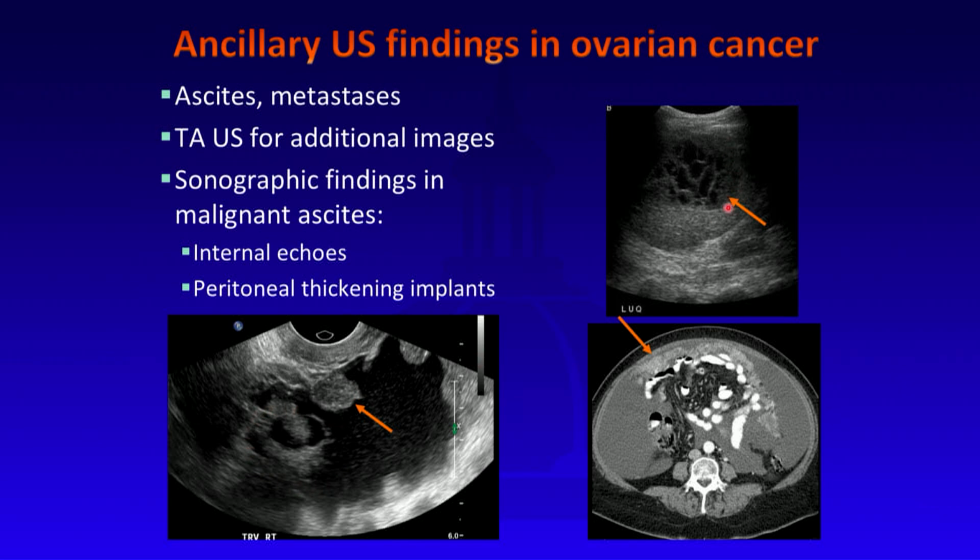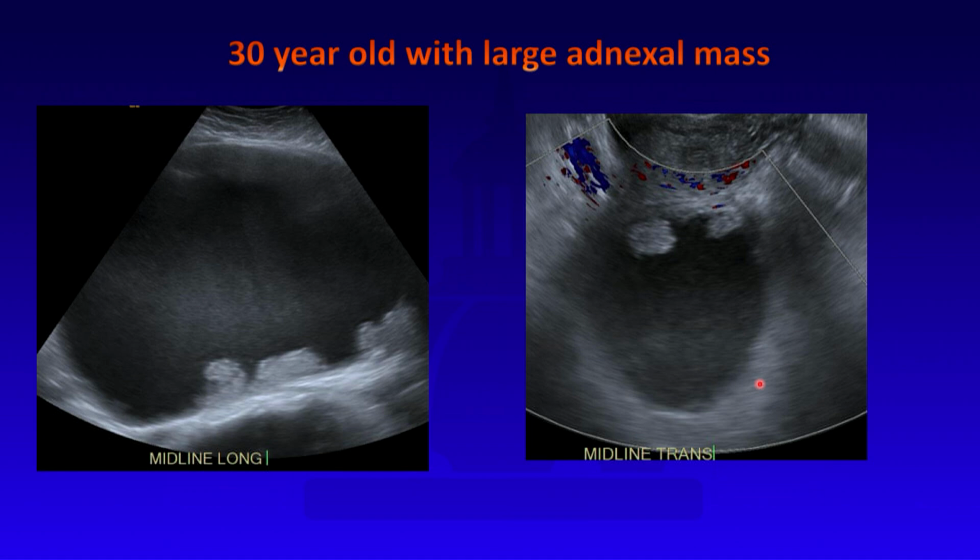In this different patient, you have this complex cystic mass around the spleen. She had known ovarian cancer, so we thought this was a tumor deposit at the surface of the spleen. Of course, CT is excellent at demonstrating even not-so-subtle cases, much more subtle than that, of peritoneal thickening and implants.